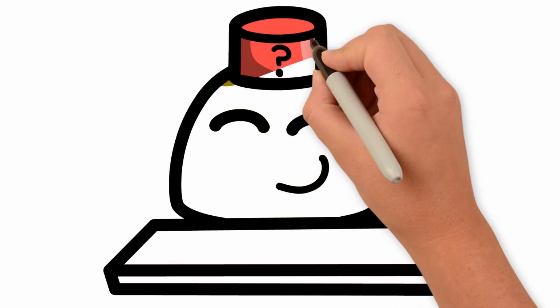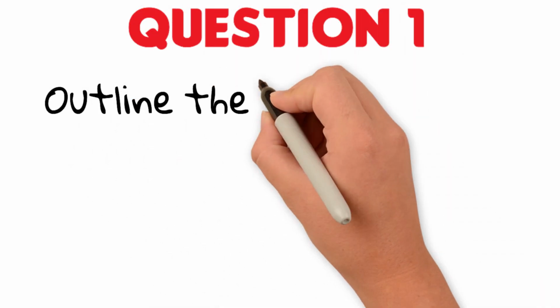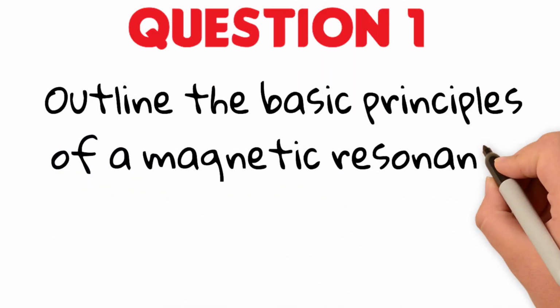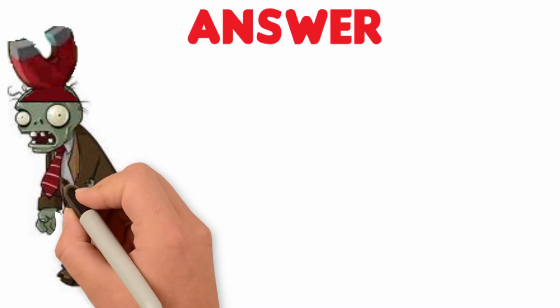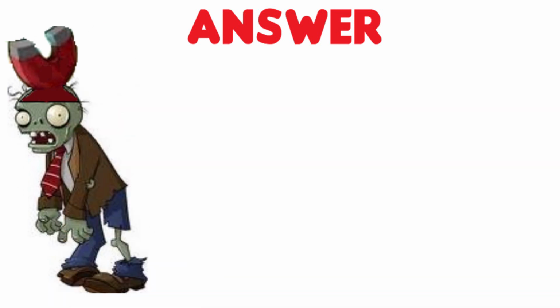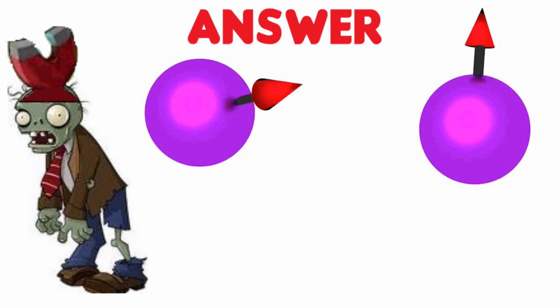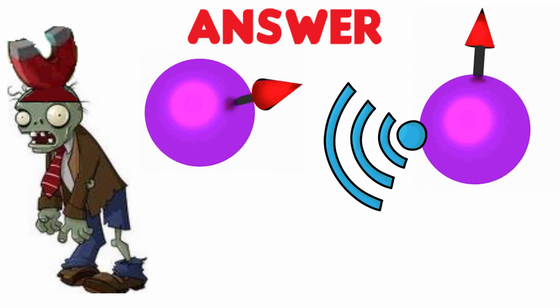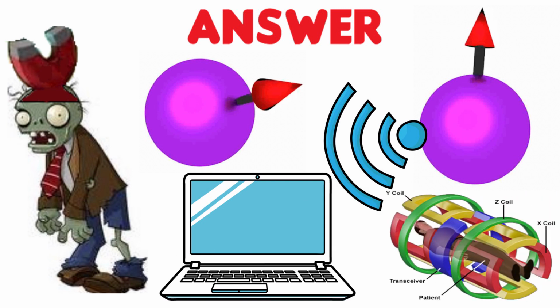And now a little quiz to refresh our memories. These questions are based on previous A-level exam questions. Question number 1. Outline the basic principles of a magnetic resonance scanner used to scan a patient's brain. Any of the following answers would give you a mark. The head is placed in a superconducting magnetic field. A radio pulse excites hydrogen nuclei. When hydrogen nuclei change alignment, they emit a radio signal. These signals are detected and passed to a computer. Gradients in a static field allow location to be determined.